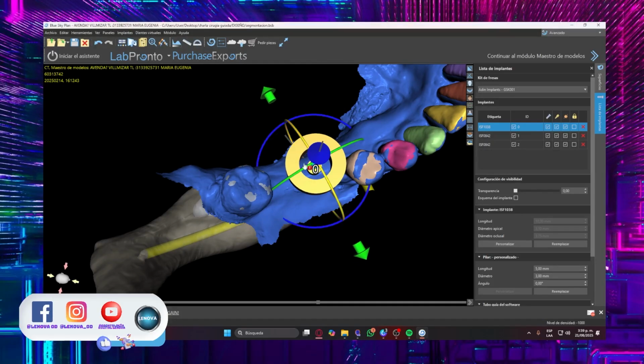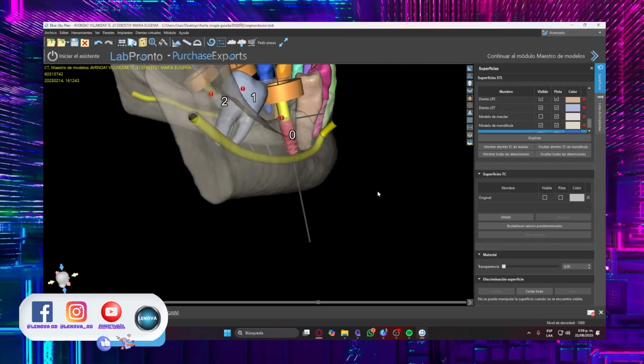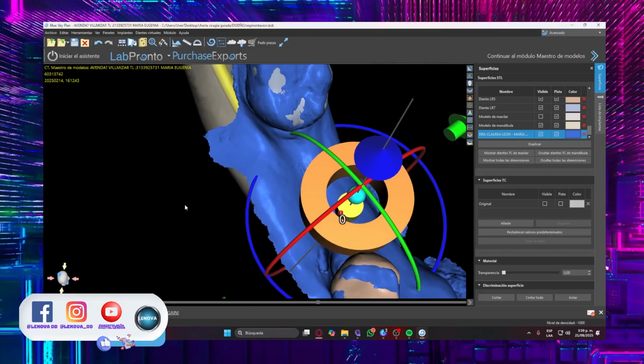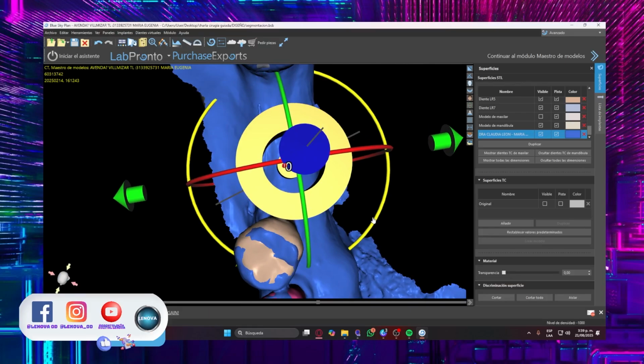You might say, we've got the implant to one side, but look at the scan. The scan sometimes shows you the anatomy, the ridge, but the bone always ends up being to one side, and it's not because it has a bad match. They are bone lesions where we see there is a loss of width, and that makes the implant have to have a somewhat noticeable divergence in those types of processes. Let's go with the next one, duplicate.